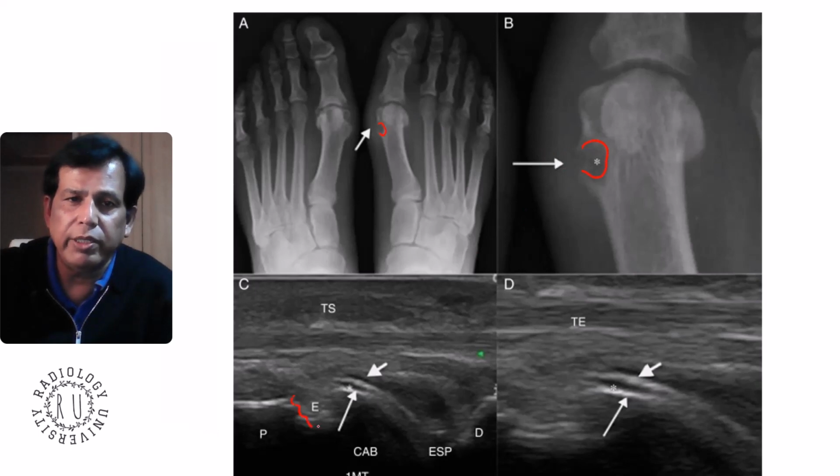Wherever you get in an exam, just make sure you describe. You say, oh, normal joint space. You say it's an erosive type of erosion with some soft tissue swelling, and because it can involve other joints, you look for other joints. Not necessarily all the time do you have to do ultrasound, but in some cases where it's more of an acute phenomenon and you don't see much erosions, ultrasound can pick up the erosion better.